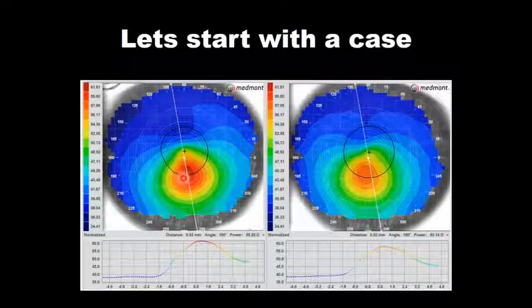In this case, from the flattest we can see, right here in this dark blue, we go from 34 diopters to the steepest we can read, 61 diopters. So that's about a 27 diopter range of power distributed across this eye. Now, normal corneas have about 10 diopters. So right off the bat, we're clear that this eye is definitely off the scale in terms of curvature.